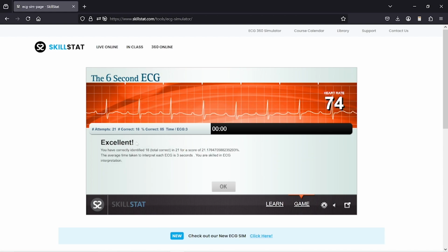So, excellent. You have correctly identified 18 total correct and 21 for a total score of blah, blah, blah, blah, blah. The average time to take to interpret an EKG is 3 seconds. Honestly, I could do a lot faster if I wasn't recording and talking. But you are a skilled EKG interpreter.